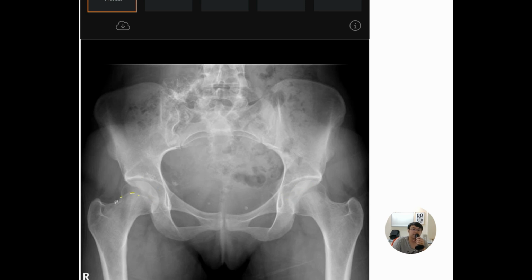Then see through the trabecular bone at the bilateral femoral neck region to make sure there is no fracture or any abnormal bony lesion. Do not focus only on the femoral neck for fracture, because the included femoral shaft region is also very classic for bone lesions. Although this is a young patient, in adult patients you may sometimes pick up bone lesions like myeloma or metastasis in the proximal femur, etc.